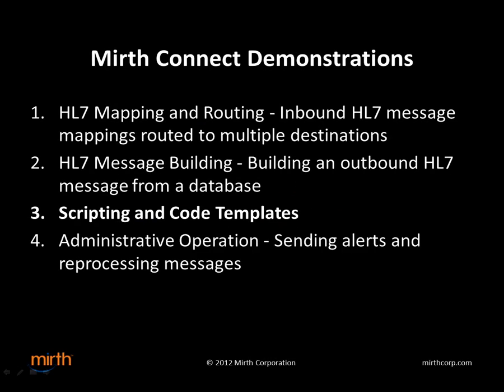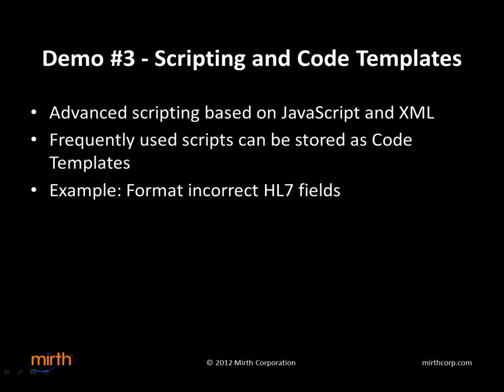Now we're going to take a look at scripting and code templates. In this demonstration, I'll show advanced scripting based on JavaScript and XML. I'll also show how frequently used scripts can be stored as code templates. As an example, I'll format incorrect HL7 fields.